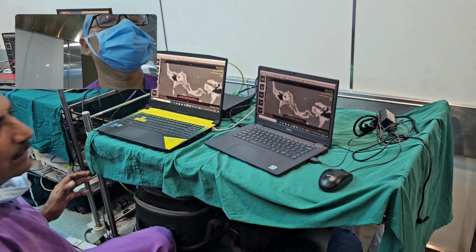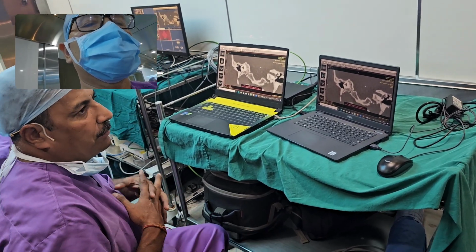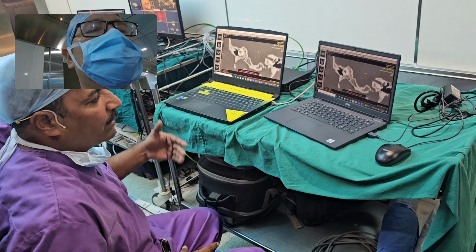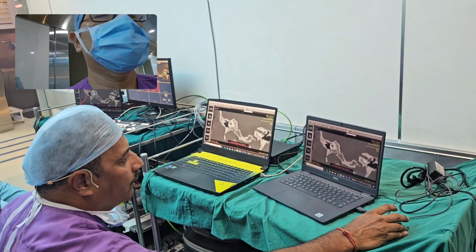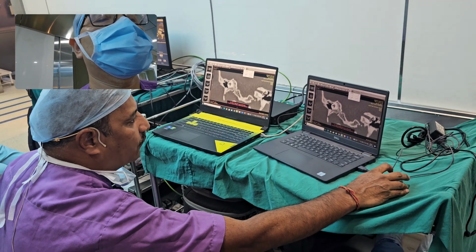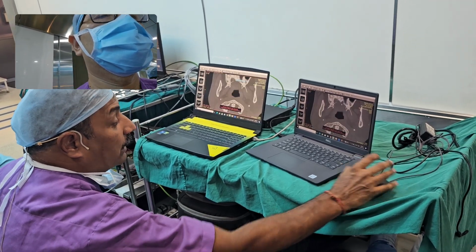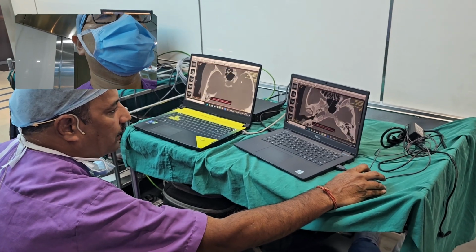Otherwise, if you don't have a CT scan and find such a prolapse and overhang, either you need to abandon or counsel your patient, or if you are not experienced, it can even give rise to facial nerve damage. So we have to be careful in assessing, and this way you can surely prevent a sorry figure to the patient.